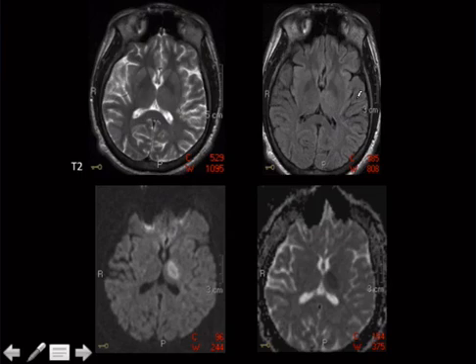So remember, white matter is white on T1. White matter is dark on T2. So here's a T2. Let's look. See how the white matter is dark? White matter is also dark here, so that's a FLAIR. White matter is white on T1. Use that for T1. Otherwise, you get your T1 and FLAIR mixed up potentially. And then down here is obviously diffusion and an ADC.